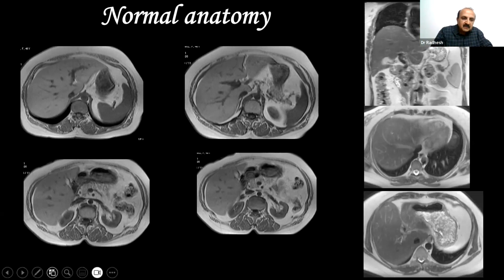And you can also have it going behind the aorta, what you call as the retroaortic renal vein, but here it is going anterior. It is normal. This is the kidney, left kidney. And what is this white area inside the kidney? On T1, white should be, yes, it is the renal sinus fat. Okay, so the renal sinus fat, again, wherever there is fat, it looks white on T1.